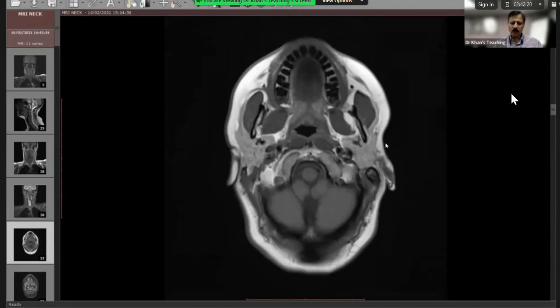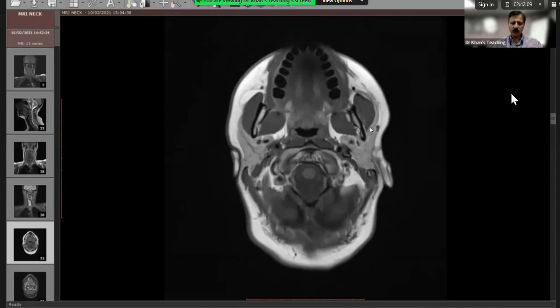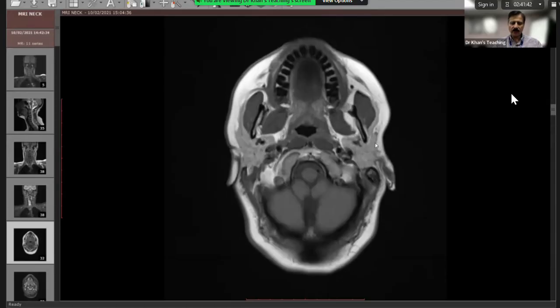And parotid gland has got two portions. One is this superficial portion. So this is the skin. So the portion which is superficially placed is the superficial portion of the parotid gland. This one is the deep portion. Deep portion is clinically not evident, which makes common sense because a clinician will not see it. And similarly, when we report tumors of the parotid gland, we have to tell the clinicians if the deep lobe is involved or not, because the surgical approach or the planning will be different.